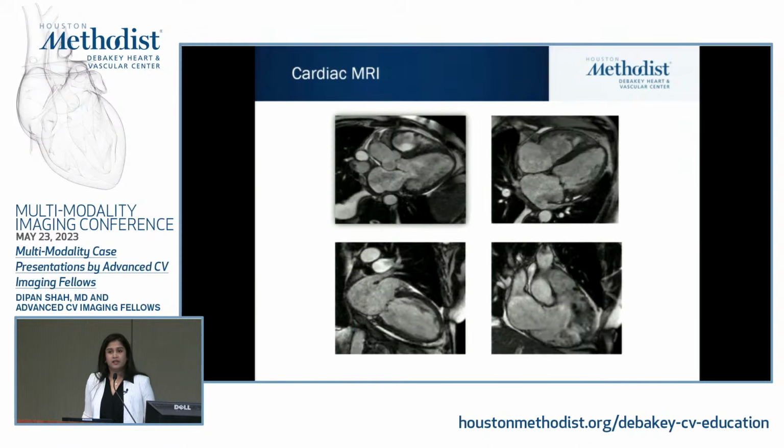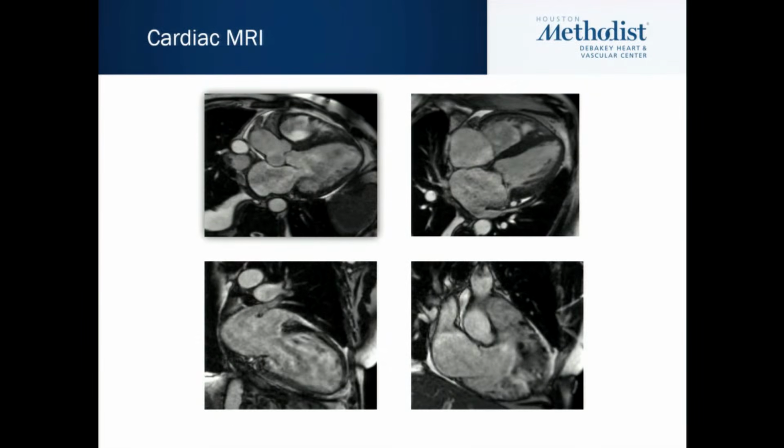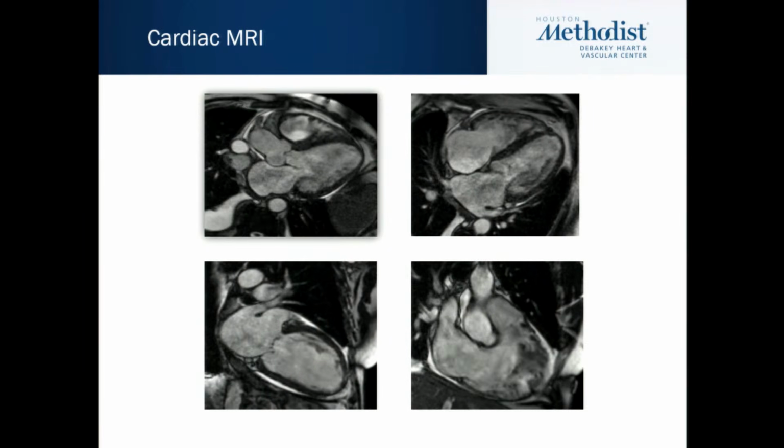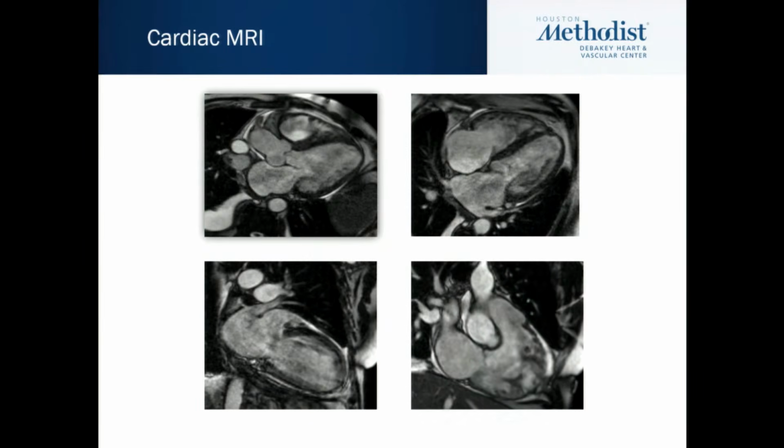We will now look at the cardiac MRI that was done on the patient. Here we have cine SSFP images of this patient, and we see a 3-chamber view here, which is similar to our parasternal long axis view or apical 3-chamber view, followed by a 4-chamber view and 2-chamber LA and LV. And then we have the unique view that we usually routinely do on our cardiac MRI, the RVOT view, with the tricuspid valve on the left side and pulmonic valve on the right side.